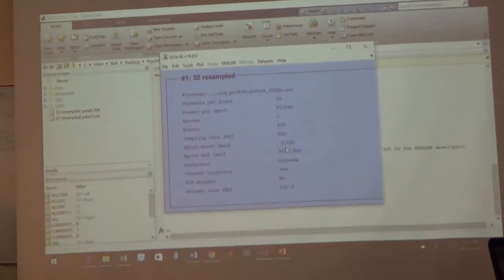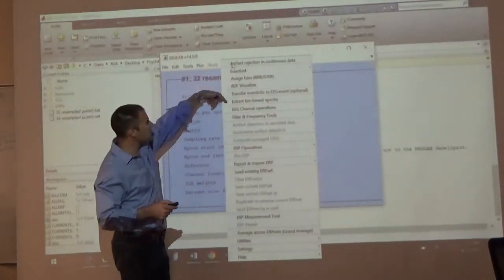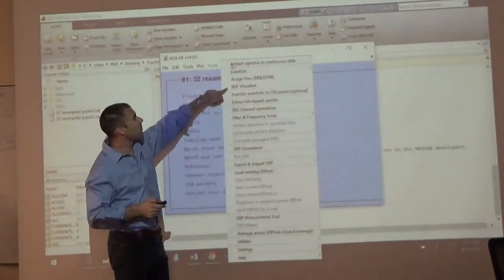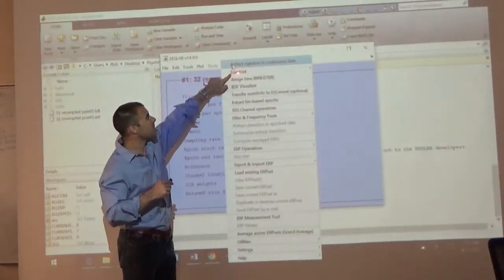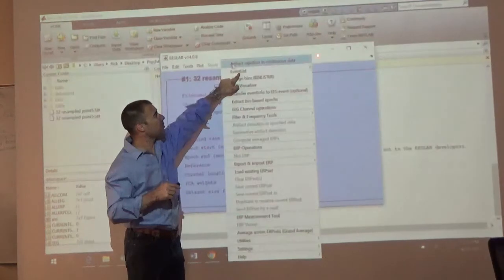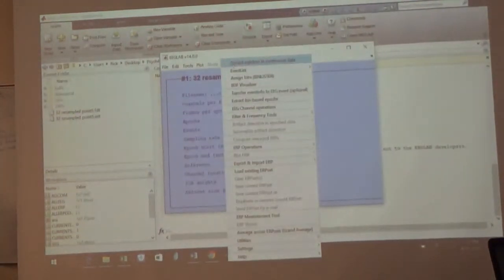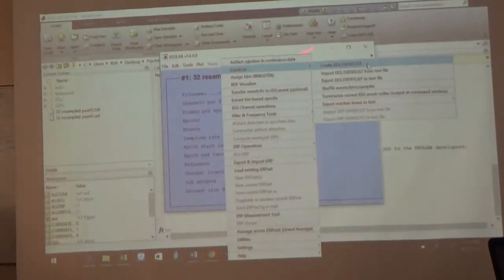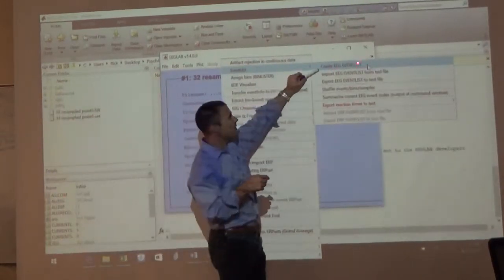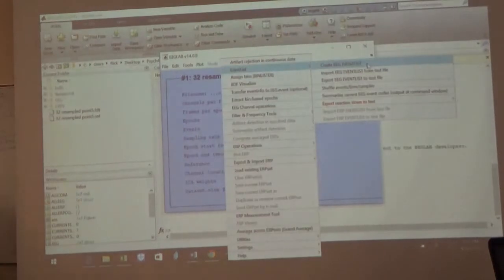So here's what we're going to do. It looks like we kind of jumped the gun in coming down here to bin-based epochs. The first thing it might ask us to do is create an events list. So let's click on that, and it'll give you another little sidebar option. Okay, so we're going to go to event list, and we're going to click on the very first option for create an events list. Everybody with me? Why don't you hit that right there?